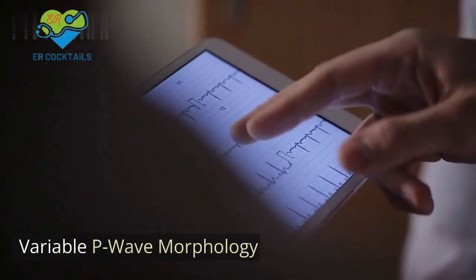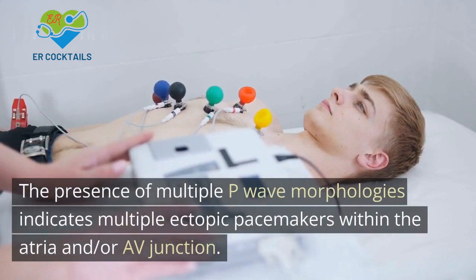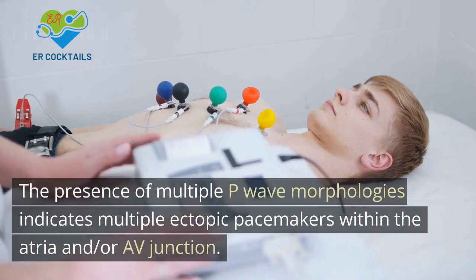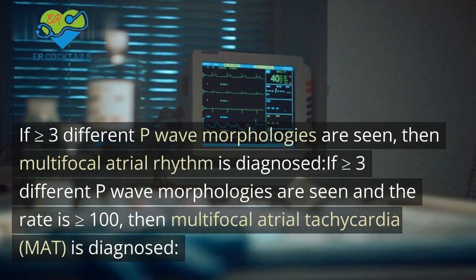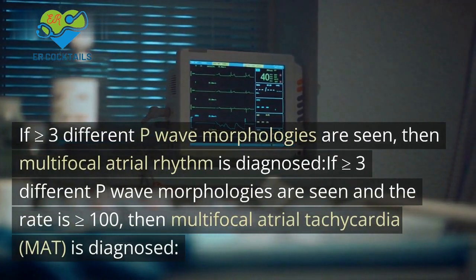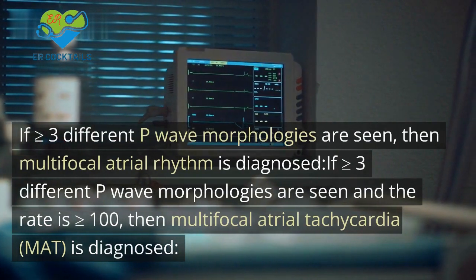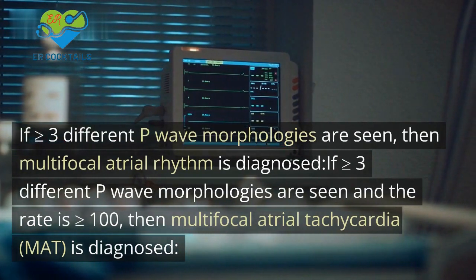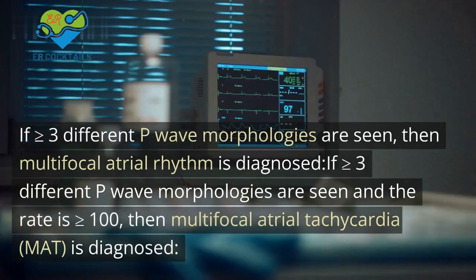Variable P wave morphology. The presence of multiple P wave morphologies indicates multiple ectopic pacemakers within the atria and/or AV junction. If greater than or equal to 3 different P wave morphologies are seen, then multifocal atrial rhythm is diagnosed. If greater than or equal to 3 different P wave morphologies are seen and the rate is greater than or equal to 100, then multifocal atrial tachycardia, MAT, is diagnosed.